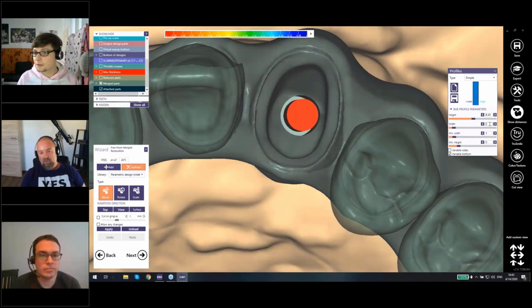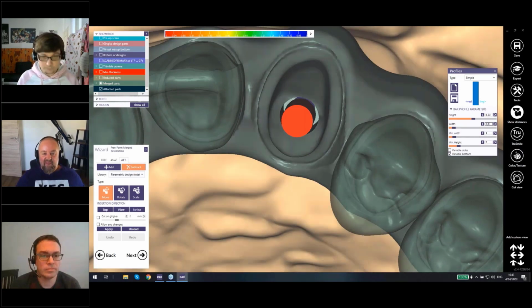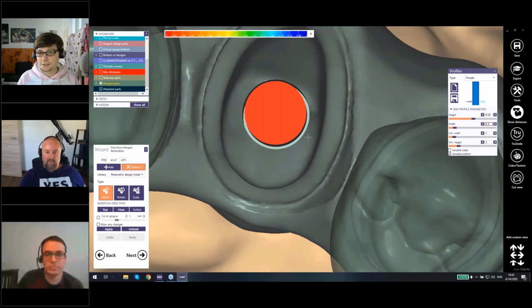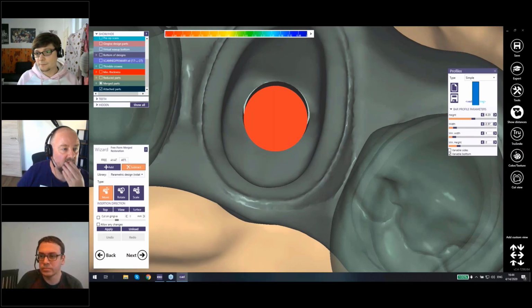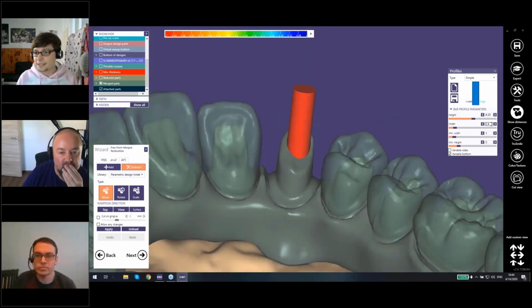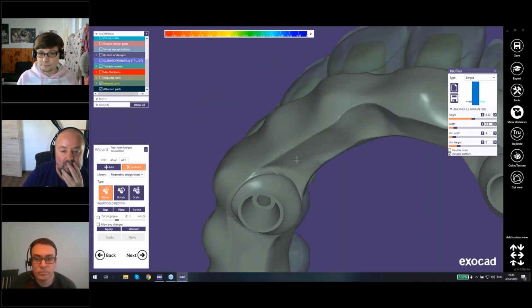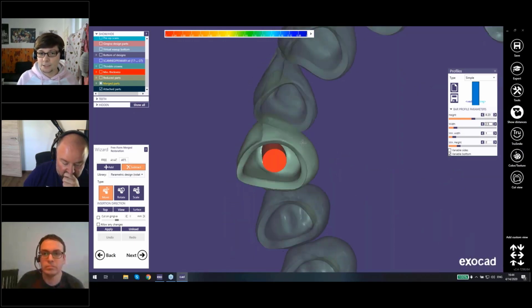The 2.3 is a very common diameter for a screw head. Yeah, or I can use my eyesight, and it looks more like 2.4 in this case. Obviously, it's better if you know exactly what parameter you have for your screw channel. And then the screw channel I'm setting up now completely intersects the crown.